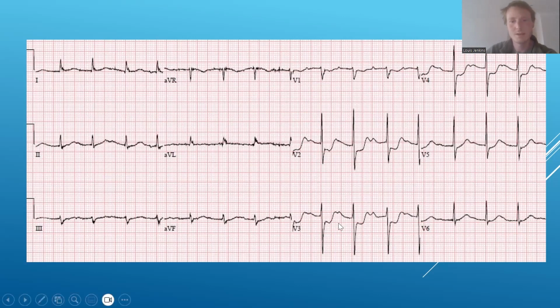So, going through it a little bit more systematically, as we like to do. Let's use red, I like that color. Can't really see the P wave. I think it's here, but it's not a big deal. We'll look in lead 2 later on for a better view, hopefully. We've got a long QT, I would say. I'm not going to bother counting it.